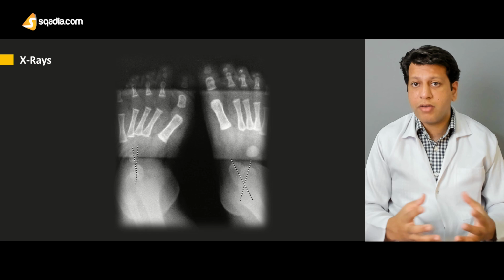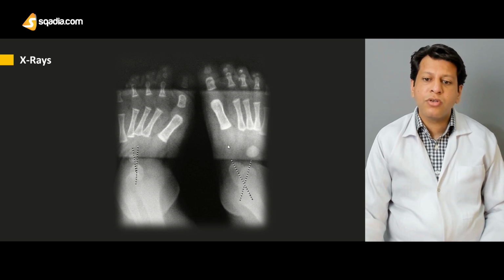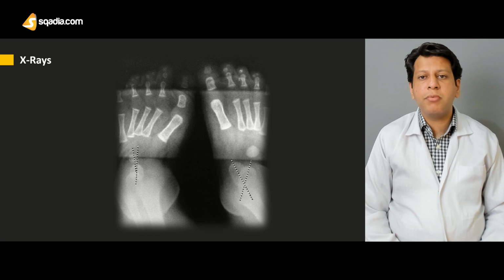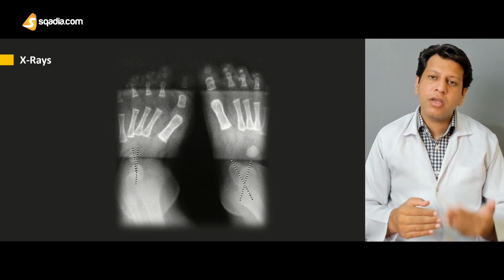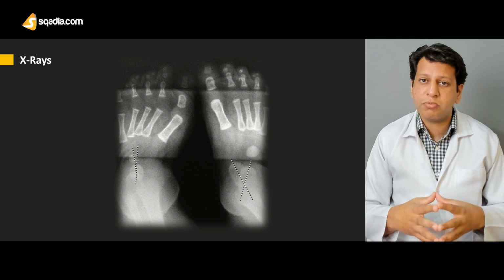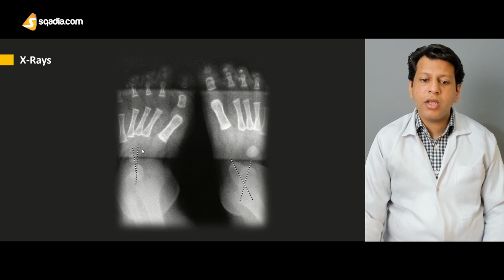When we cannot see the navicular, the way is that this navicular would be articulating with the first metatarsal, and you can see the ossification of the first metatarsal. So we take the first metatarsal axis as a reference point for the navicular. Instead of calculating the talonavicular angle, we calculate the talo-first metatarsal angle, and it's normally between 0 to 20 degrees in a normal foot. If you calculate the talo-first metatarsal angle on AP, it's usually negative. It comes out to -5, -10, and even -15, depending upon how problematic the foot is.